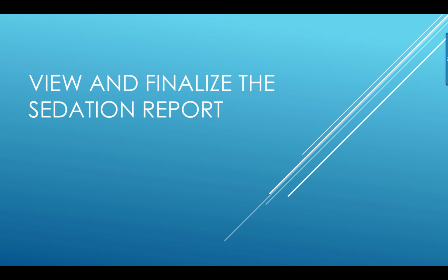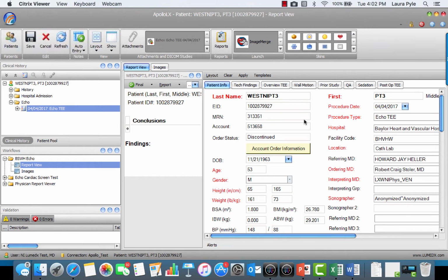View and finalize the sedation report. If sedation was not administered by an anesthesiologist, the RN will complete a sedation report if she administered any sedatives. As the physician, you are responsible for reviewing the sedation report and finalizing the report.